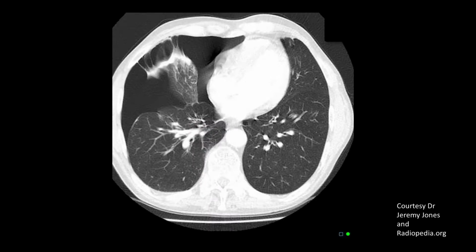This is the point where the pleura go from being in contact to not being in contact. As we can see here on this chest CT, the location of this point changes somewhat with inspiration and expiration, which is why we see intermittent sliding and loss of sliding at the same location on the pleura.